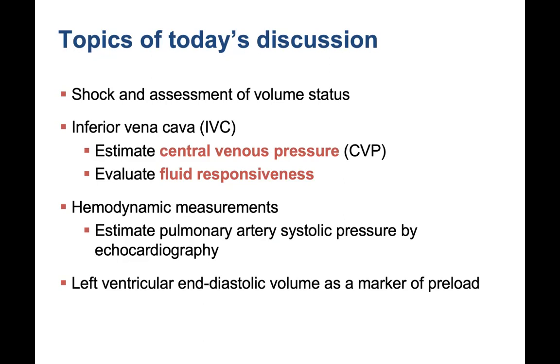We will then move on to talk about hemodynamic measurements. So we'll estimate PA systolic pressure by ultrasound, and then we'll end with talking a little bit about left ventricular end diastolic volume as a marker of preload.